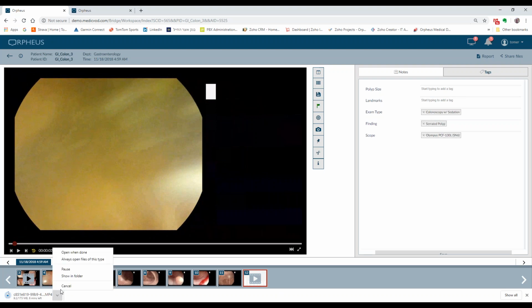Now you notice what appears here. The name of the file doesn't contain any patient demographics. That's important to remember. It downloads it with a GUID, a unique identifier of the file that has no relation to the actual patient that is being displayed. I'll cancel this because it's almost 200 megs.